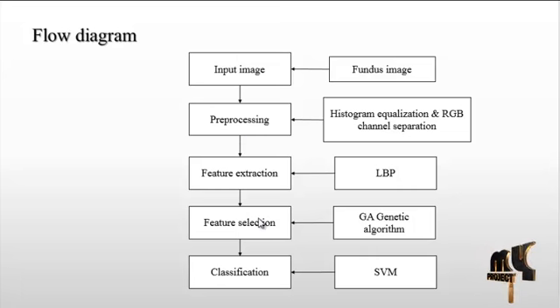And then the feature selection. In the feature extraction process, all the features are extracted from the pre-processed image. In the feature selection process, we select particular features from those extracted. Here we use the genetic algorithm, which is an inbuilt function in MATLAB. By using the genetic algorithm, we calculate the feature selection to estimate the best feature values from the previous feature extraction step.